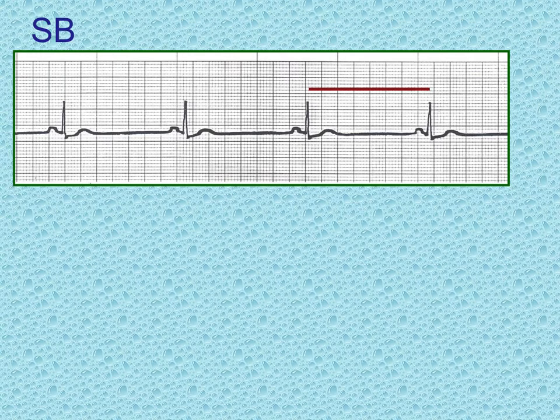So morphology is going to come into play later on when we consider other dysrhythmias or funny little beats that might come into our rhythm strip. And we might have to do further analysis of maybe 1 beat or 2 beats on our 6-second strip. But for all intents and purposes, this top strip is sinus bradycardia at a rate of about 40.